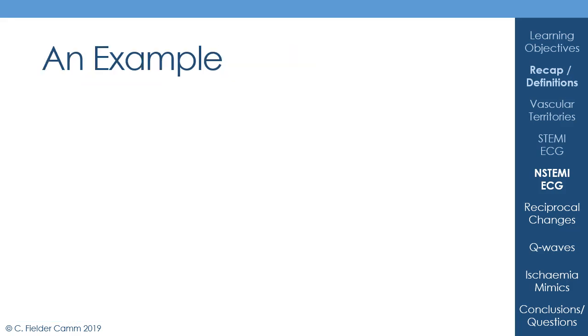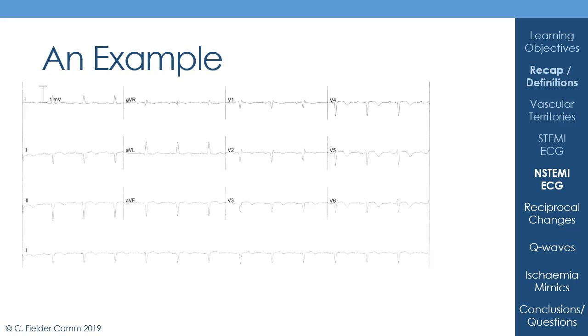So here we have another example ECG. I'm going to pop it up on the screen. I'll give you a few seconds to pause the lecture and interpret it for yourself. I apologize in advance for this ECG being a little low quality. As you'll see, it's not on pink paper, and we will skip through some of the interpretation relatively quickly just to get to the real meat of things. But here's our ECG, so feel free to pause.